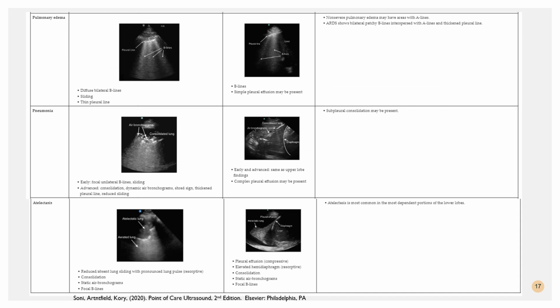Here we have a patient that is going to have pulmonary edema. So they're going to present with dyspnea, and then you start your exam. Now their lungs are going to be expanded, so you should still see that pleural sliding, but now they're going to be consolidated, and so you're going to recognize these 3 B lines. They're true B lines because they're narrow at the top and they ray out distally, and they're continuous from the pleura down all the way to the far field. So when you see that, you're going to be able to find this bilaterally, since pulmonary edema would be a bilateral process.